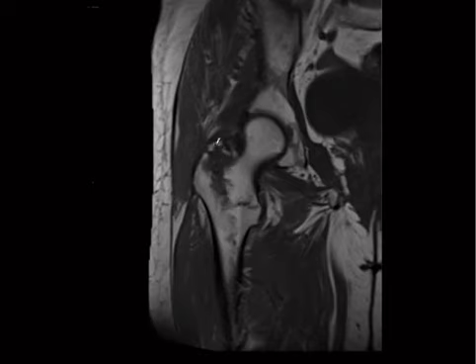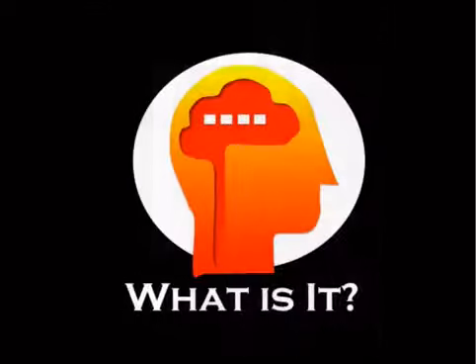So, whereas I don't know what the management is for a fracture that's isolated to the greater trochanter, let's just say that it's conservative. This might not be treated conservatively now that it's all the way through. So it changes management. So it's a good next step question. If you see a little fracture in the greater trochanter, you need to get an MR to look for extended disease.